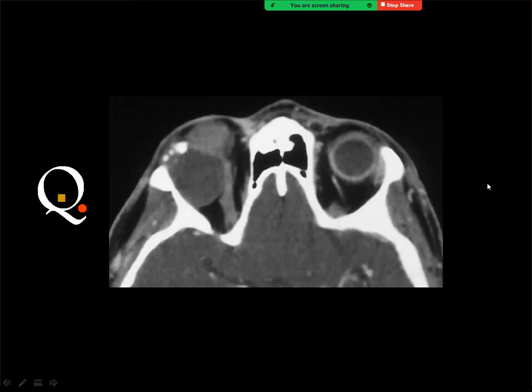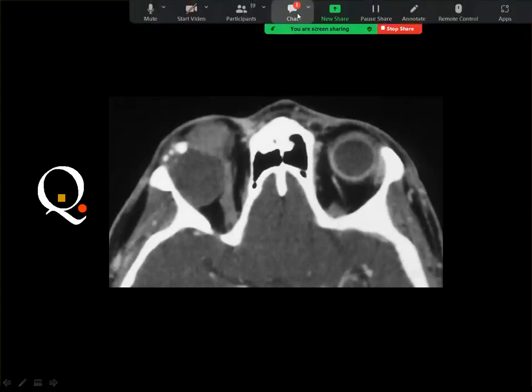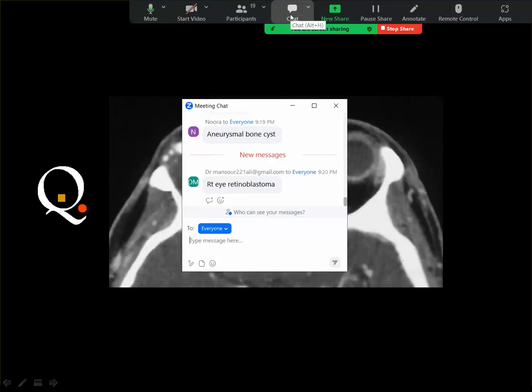And actually, aneurysmal bone cyst is one of the rarities in the mandible, and you should not diagnose this possibility from the plain film or the mandibular panorama, because there are much more common lesions in this area. But whenever you have the CT scan or an MRI and you see the classic fluid levels, then you may diagnose aneurysmal bone cyst. What do you think of this lesion?